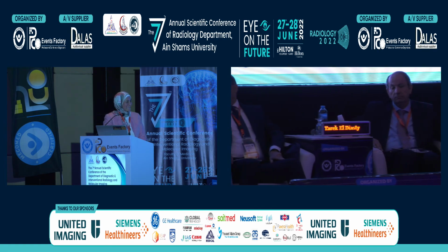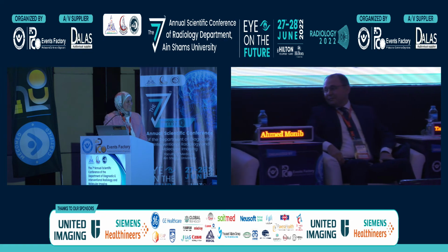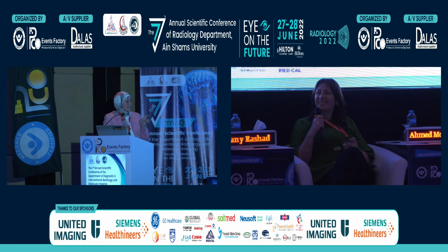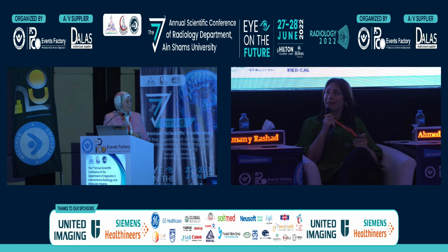سؤال كده بس يعني معلش. What is the relation، يعني إنهم بيوصفوا an inchworm appearance? You know what the inchworm is? اللي هي الدودة، طريقة المشي بتاعتها إن هي بتبقى curved وفي النص ما فيش. This is how it appears, how it looks like in the diffusion weighted image. Yes, it's a classic appearance for non-muscle invasive bladder cancer. Exactly. Okay, thank you very much.